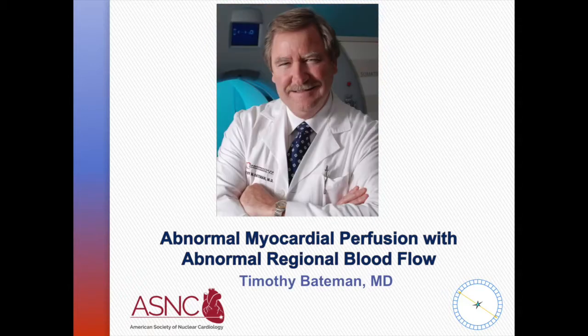So this case went directly to PET instead of some alternative type test. There may be many reasons for that. Would you like to comment on some of the things that might influence in a young person like this to go directly to PET instead of, for example, a stress echocardiogram?